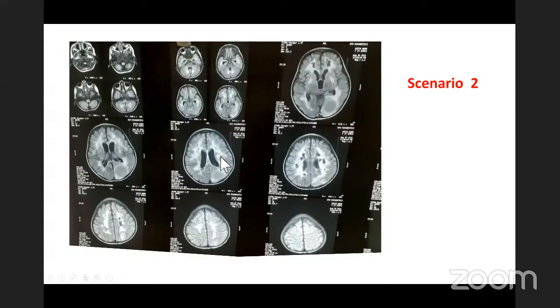This was the preliminary complaint in which the child had come with global developmental delay. We were suspecting some mitochondrial lesion, but then again, this child suffered severe infection, was obtunded, had to be intubated, and when we repeated the MRI, these baseline changes were always there with the child, but we found that there was a well-circumscribed hyperintense lesion again in the left parieto-occipital region.